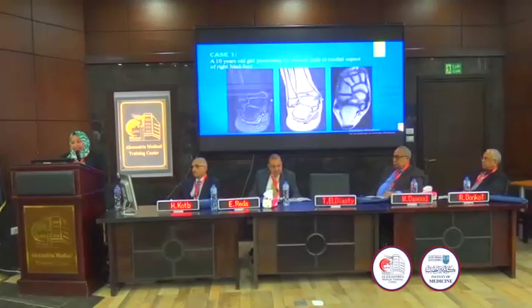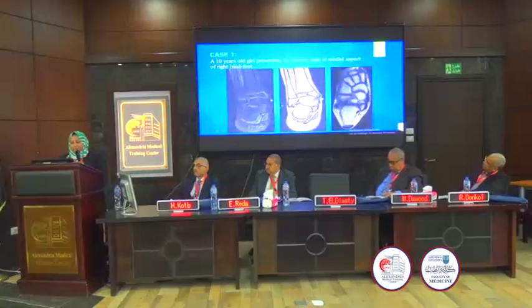We should remember that I went through the common causes of midfoot and hindfoot pain, but we have many more causes and many more anatomic variants which could be the source of the patient's complaint. And I would like to share with you two cases with unusual anatomic variants causing the patient's complaint.